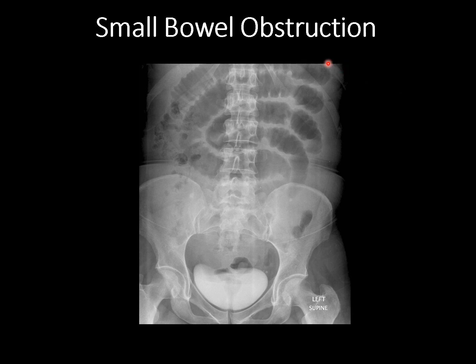Again, we're really seeing some of the same findings, so just many dilated small bowel loops throughout the mid-abdomen and a normal caliber colon tracking at the right abdomen here and probably in the left abdomen and pelvis here. The bladder is bright on this radiograph just because the patient probably had a recent contrast administration and now the contrast is within the bladder.